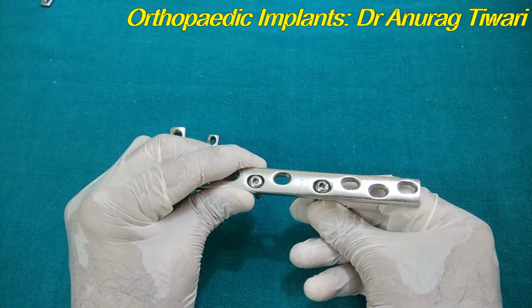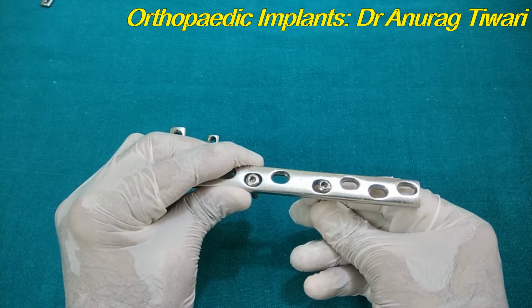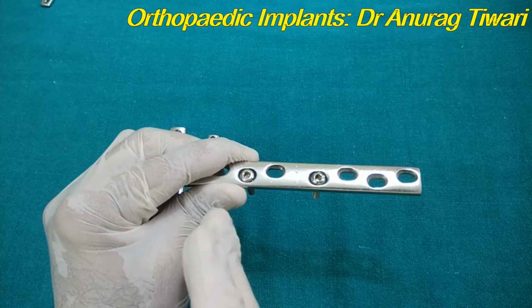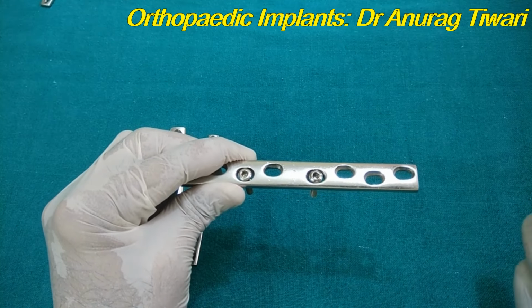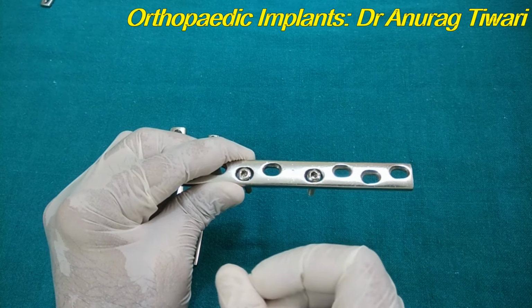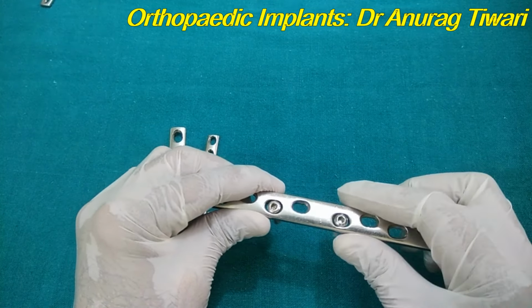This is the central mode or the neutral mode, and this is the eccentric mode or the compression mode. So when we tighten, the screw will move towards the fracture site, and this will cause the bone to move towards the fracture site, and this will create a compression. That is the mechanism of how we get the compression in the DCP.